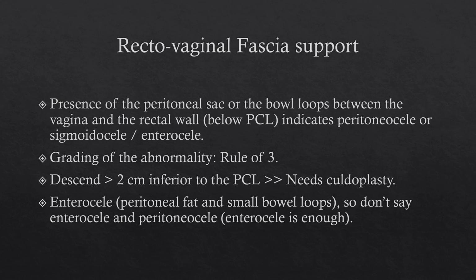Once we have enterocele, say it is enterocele, because of course enterocele means a peritoneal defect with bowel loops within. If we have a peritoneal sac only, then it is peritoneocele, not enterocele.